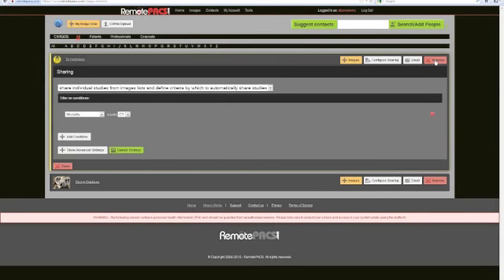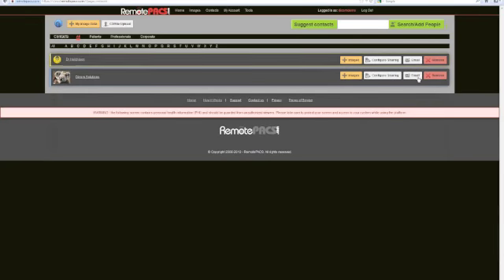They'll no longer be able to view your images. So if a physician leaves the practice or a staff member leaves, you can just click right here and remove them, and they'll no longer have any access to any studies, either old or new. So you have complete control over who can see what studies at all times. You can also email them directly from here if you want to send a quick note to them. And if they're sharing any images with you, you can take a quick link right here to view their images by clicking.